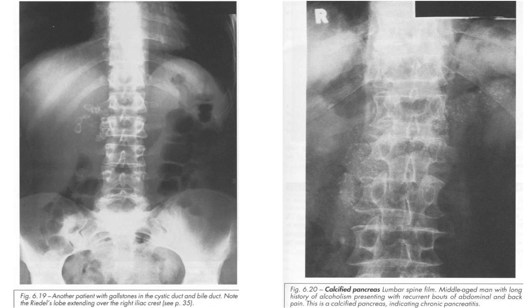You can see there is another type of calcification on your left. It is a gallbladder calcification in the right upper quadrant. Then crossing the spine, you can see very tiny calcifications that belong to the pancreas. So we are in the presence of chronic pancreatitis, and the other one is cholelithiasis.